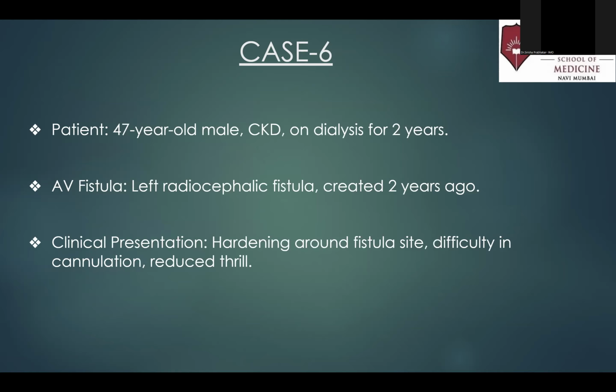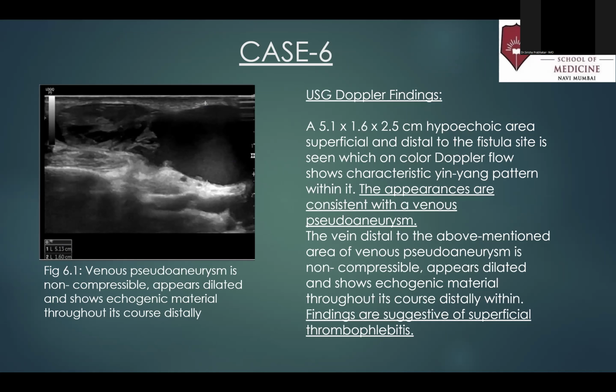Then the sixth case was a 47-year-old male, CKD on dialysis for 2 years, left radiocephalic fistula created 2 years ago. Clinical presentation was hardening around fistula site, difficulty in cannulation, and reduced thrill. This case can also be called double trouble. I can tell you why.